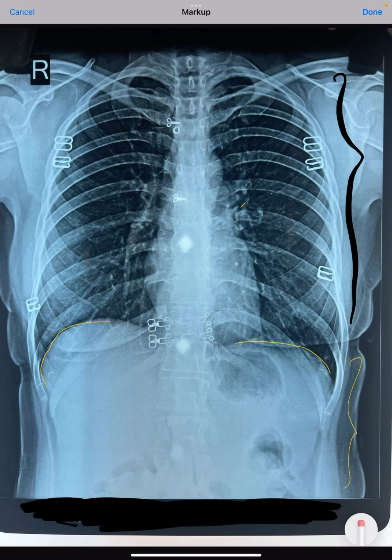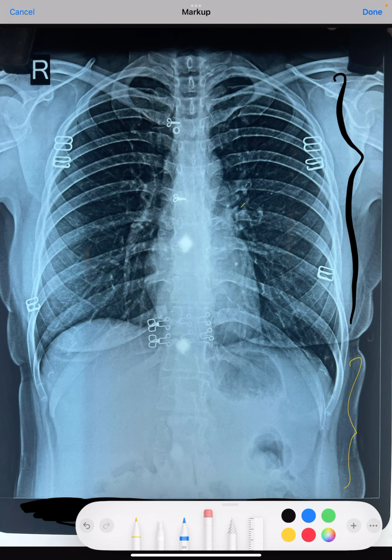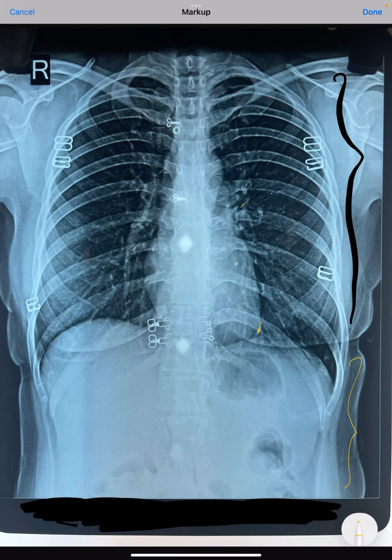One of the most important things is that we should always see the apex. This is the apex of the LV. This whole portion is the left ventricle, the left ventricular free wall, and the lowermost and outermost part of the left ventricle over the precordium is called the apex. So this is all apex. This is the apex, where we can actually see the apex beat.